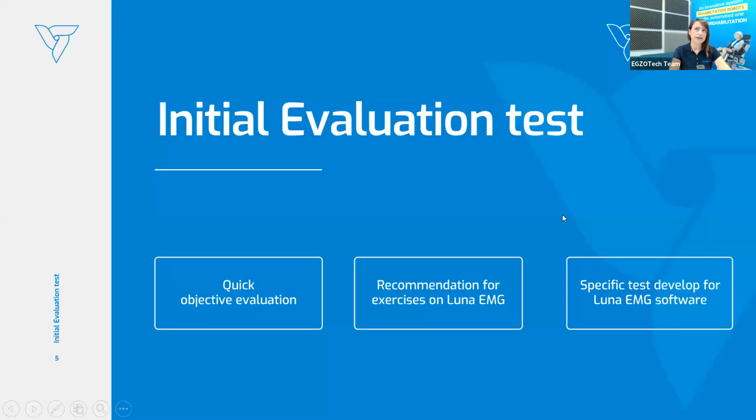And this is something that our sales representatives use a lot, and they are PTs as well, but they use it during their presentation for the customers because it's such a quick test and can help out with understanding of the device.